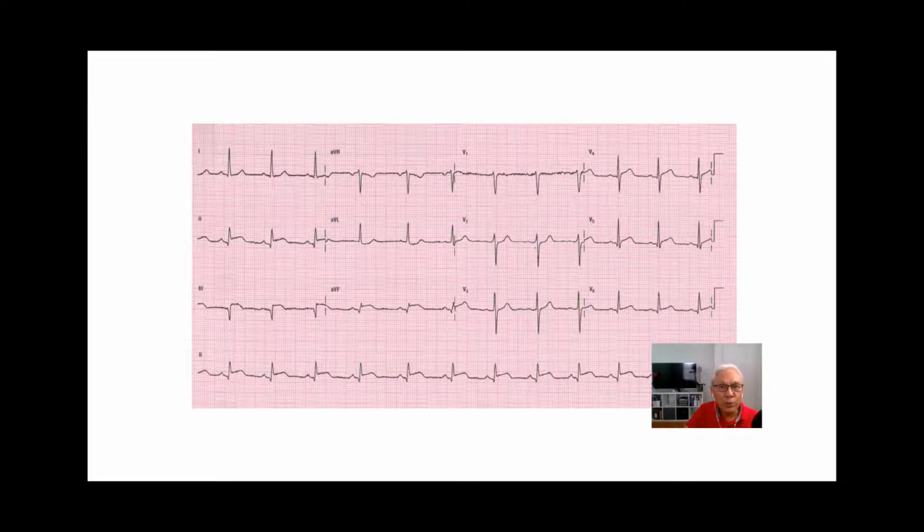I want to caution you that V4, V5, and V6 have an ST elevation of 2 millimeters, and you probably will not be able to see this unless you enlarge the image or you use a magnifying glass. But on my end, since I'm able to magnify the slide, it is showing that the ST elevation in V4, V5, and V6 is at least 2 millimeters.